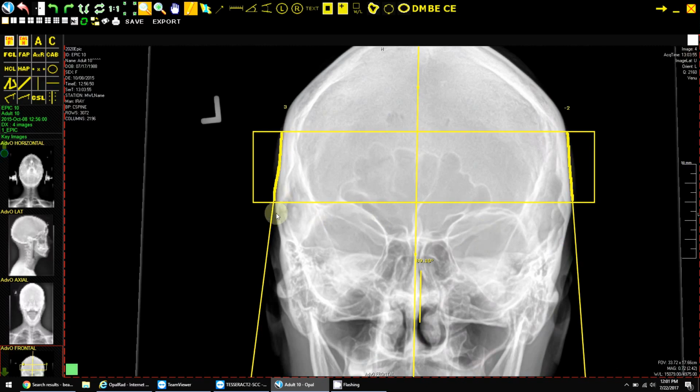the slope of the skull, and it's just extremely fast to be able to use. For that, I absolutely love it. There's a few cons though. The con is, well, actually, another pro just to show you.